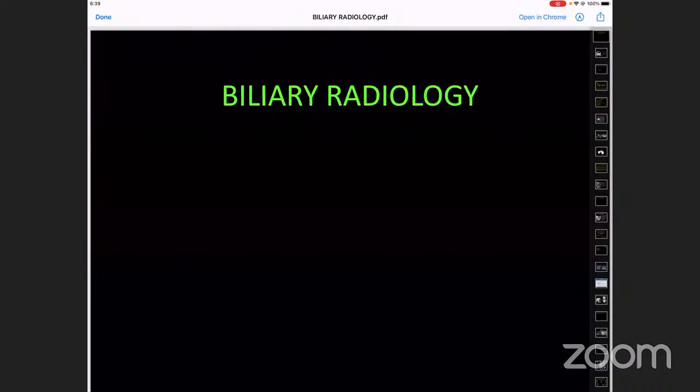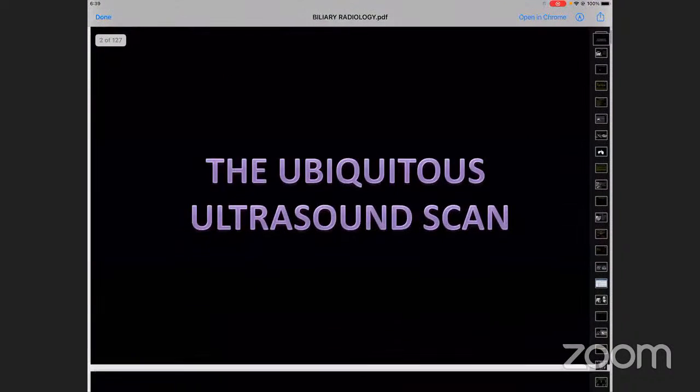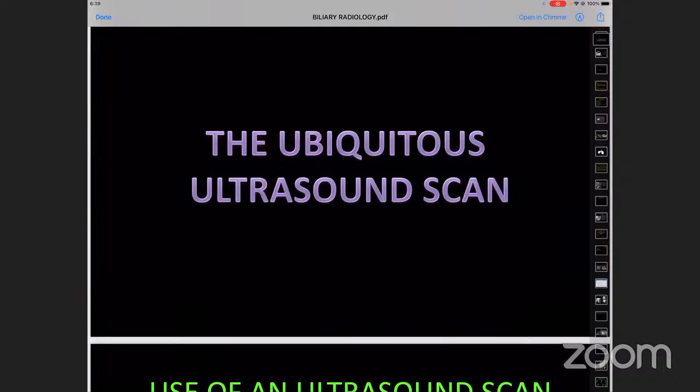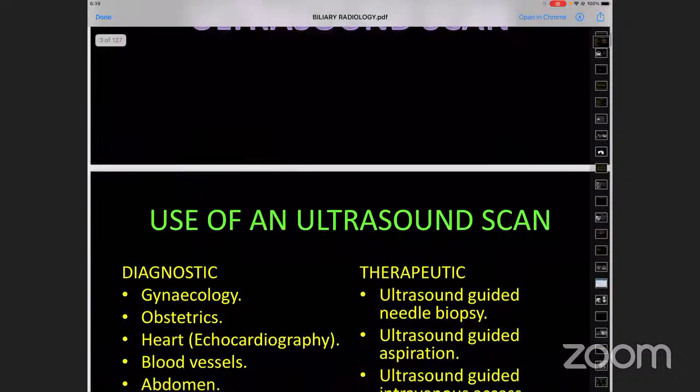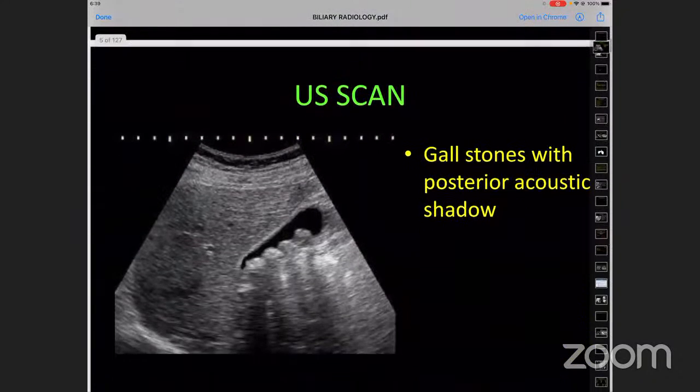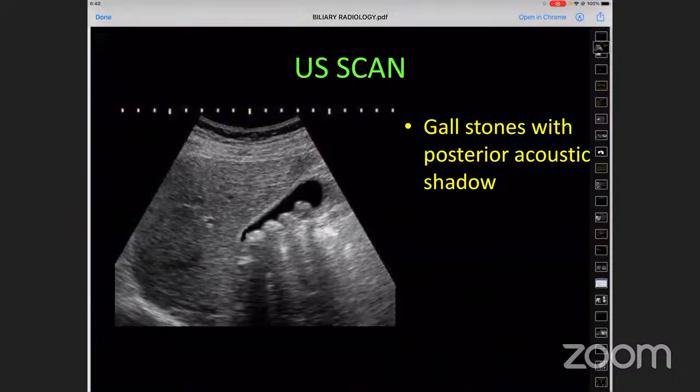As we have mentioned, we start with biliary radiology, and all of you must have had your share of understanding about an ultrasound scan. The first thing we have on an ultrasound, rather than talk about radiology jargon, is that we surgeons are interested in understanding the patient and the image, and then taking the patient to the theater for an operation. This picture is a very common encounter that you may have had even today if you have done a cholecystectomy, or maybe tomorrow.